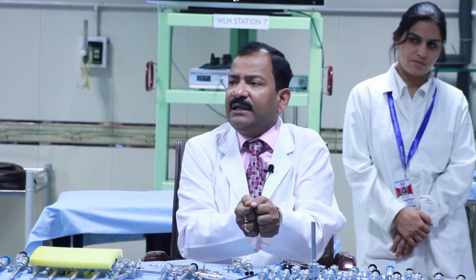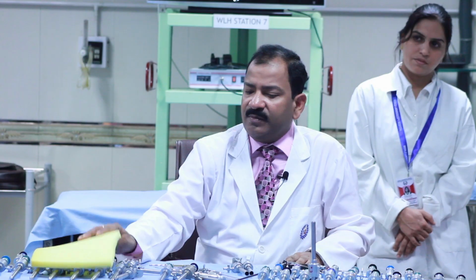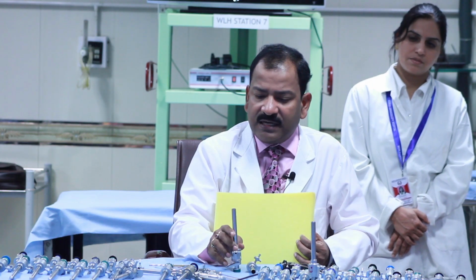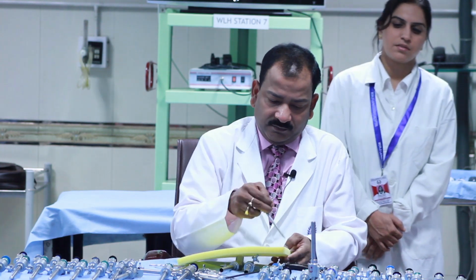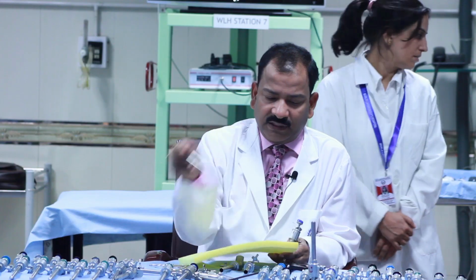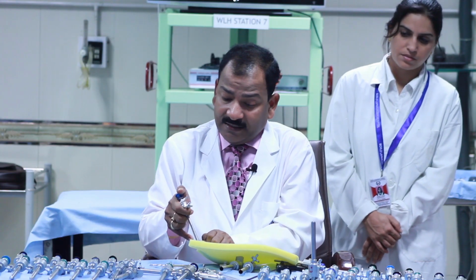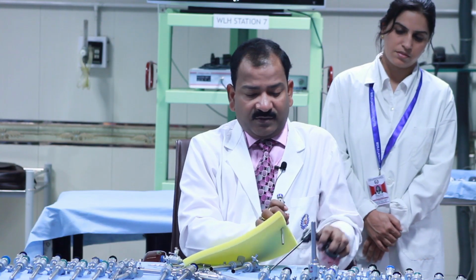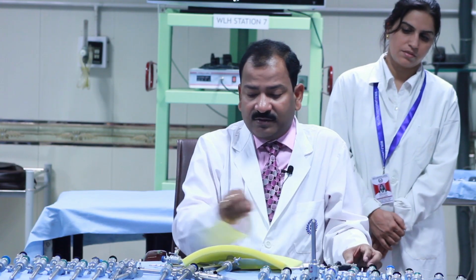In open surgery, we can make it any time 60 degree, 30 degree, 15 degree. This is flexible because everything is open. But in laparoscopy, it depends upon your port position. Suppose this is a uterus or this is the appendix, and I put one port here and one port here. Now, I cannot change my manipulation angle, and I put one instrument here and another instrument there.